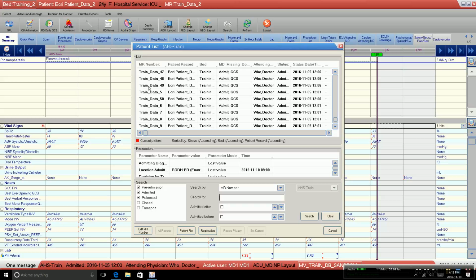And when I'm searching for a patient, I can either just scroll through all of these lists, or I can use the MRN, or I can use the patient's name, and I can sort by just clicking on these headers to give me the alphabetized or descending order. If I'm looking for a specific patient and I know their MRN, I can enter it in here. Or if I know their last name or their first name, I can also use those as selection criteria. I would enter in whatever MRN I have and then just click the search button.